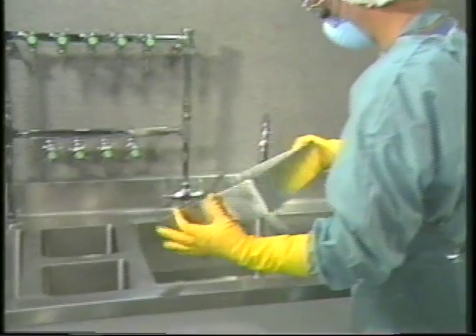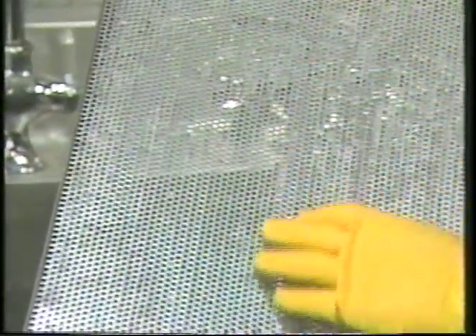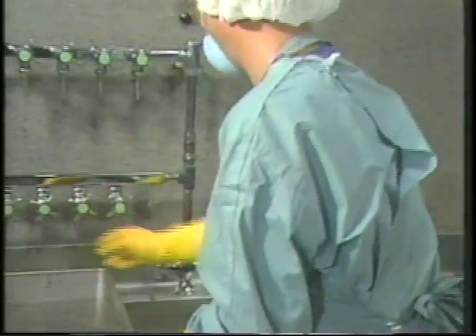Baskets or trays to hold small objects or instruments should be properly sized to contain the load, but also to provide adequate exposure and surface coverage to the load. Accessory baskets should have holes large enough to allow for adequate coverage of turbulent water, but also to assist in drainage after the washing cycles are complete.